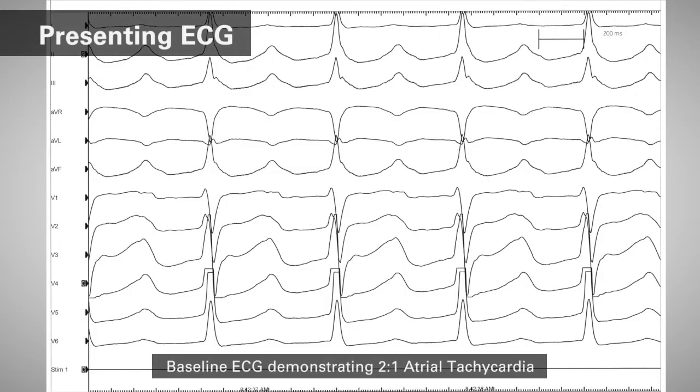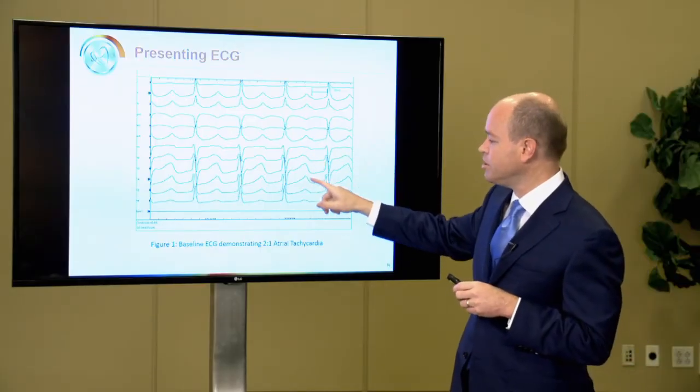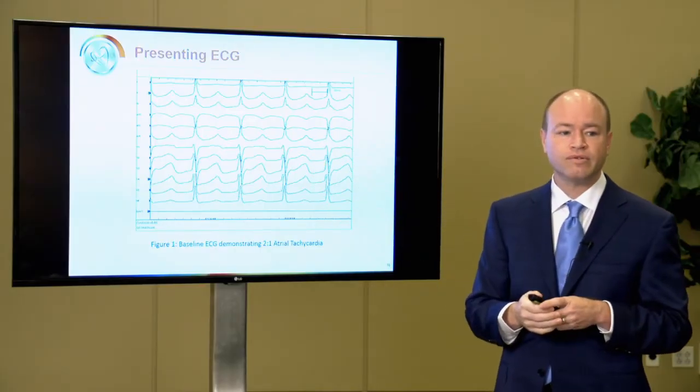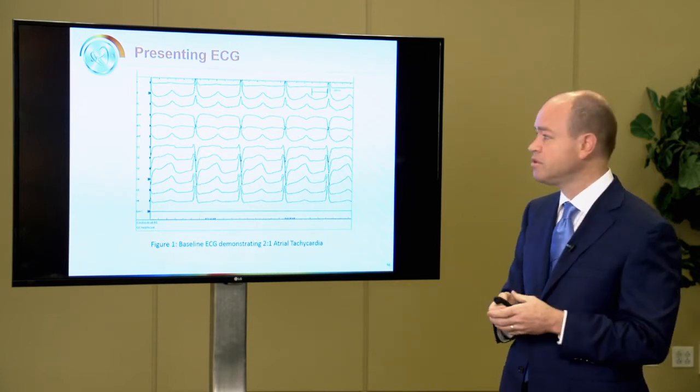This is the presenting electrocardiogram demonstrating that this does have an atypical appearance, not a typical atrial flutter appearance, as buried within the T waves is a positive P wave located in leads 2, 3, and AVF. It also looks suspicious to be positive in V1 through V6 leads, all consistent with atypical, probably left atrial origin.